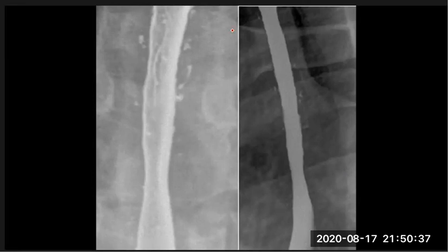And these are multiple intramural pseudodiverticulosis, and usually it is in the mid-esophagus. So we see two types with this case: epiphrenic diverticulum and intramural pseudodiverticulosis. Next case, any question for this? Okay, I think it is okay.